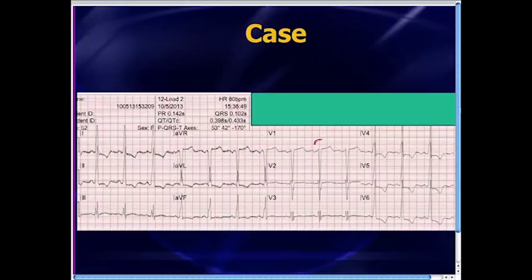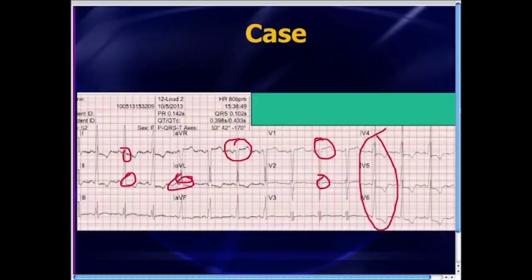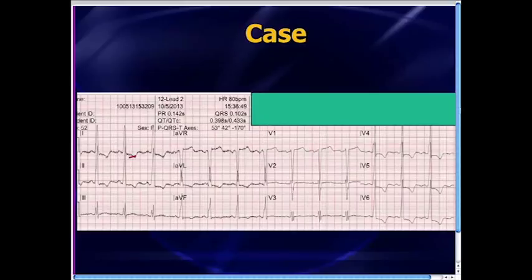Take a look. There's ST segment elevation in some of the leads, maybe a little bit of ST segment elevation there as well, and in aVR, ST segment elevation there. That's concerning. We've talked about that before. There's ST segment depression in II, and in I, I missed that. aVL, lead I, and maybe some ST segment depression out there. There's also T-wave inversions in a bunch of leads. There's a whole heck of a lot of abnormalities here that ought to be making us think of cardiac ischemia and maybe activating the cath lab, right?